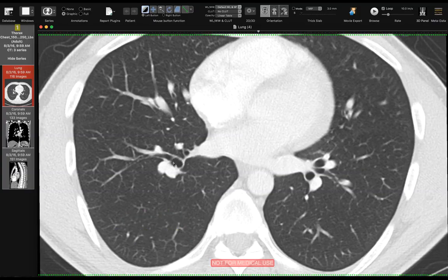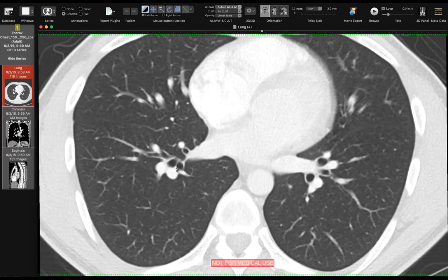And then we have a division of this last branch into two branches, and that is the L and the P. So this one that goes lateral this way, this is the lateral segmental bronchus, and this one is the posterior segmental bronchus. Okay, so M, A, L, P. And those are the segmental bronchi on the right side.